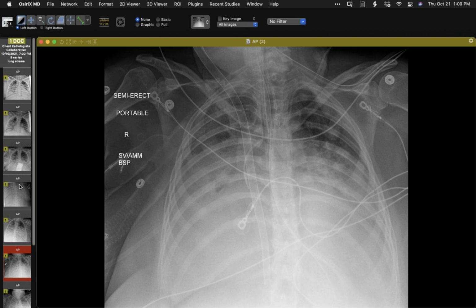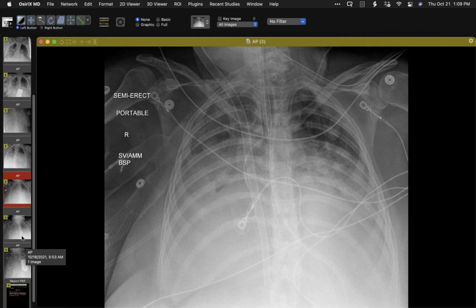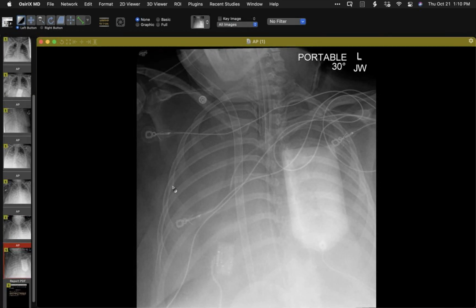And you can see that progressively over time, I'll show you that aeration of the lungs just disappears. And now we're at the point over here, certainly here, when we have really just no aeration of lung. So the notion of so-called white lungs of ECMO is sort of a known thing. It has been described in the context of patients for various reasons on veno-arterial or central ECMO or peripheral ECMO. And this is a patient that really has non-aerated white lungs.